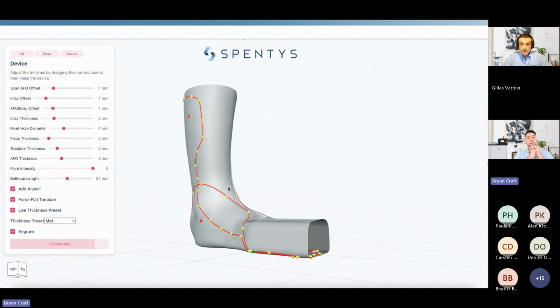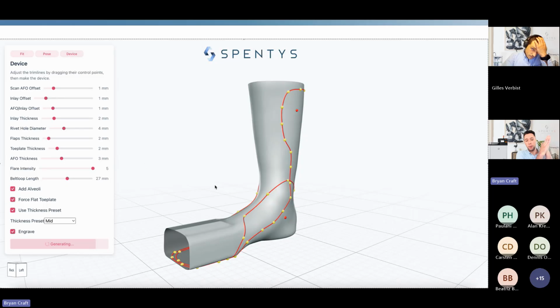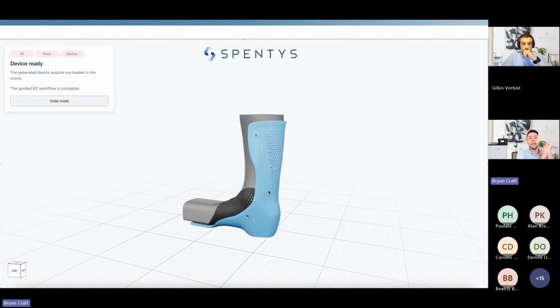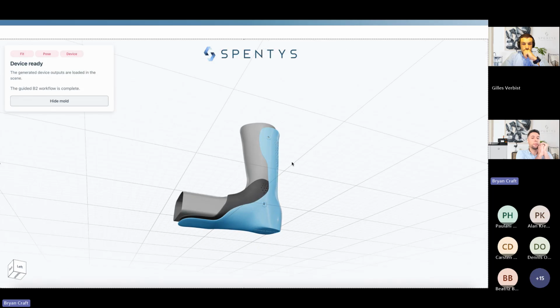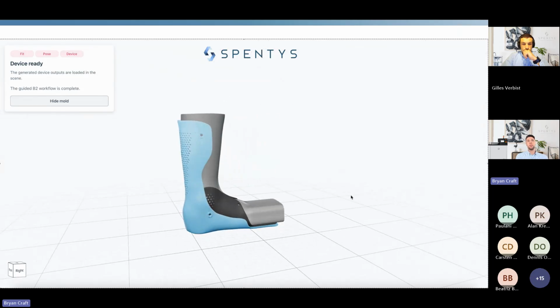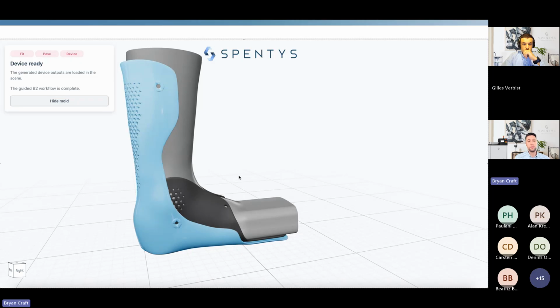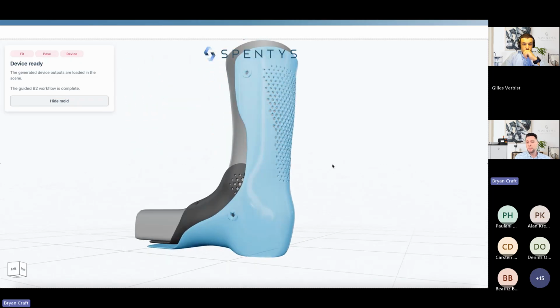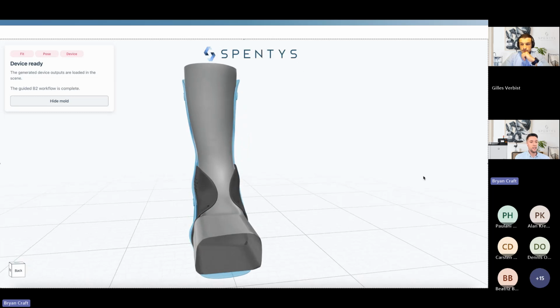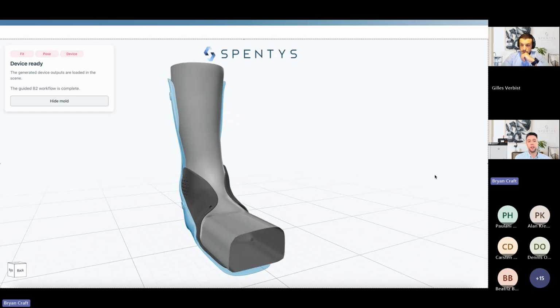But after I specify my recipe, I press generate, and automatically the AFO and molded inner boot will populate on the mold. So an order of magnitude faster, and while maintaining quality, because speed's not the only part that matters here, right? You can't just go fast and then lose your quality.